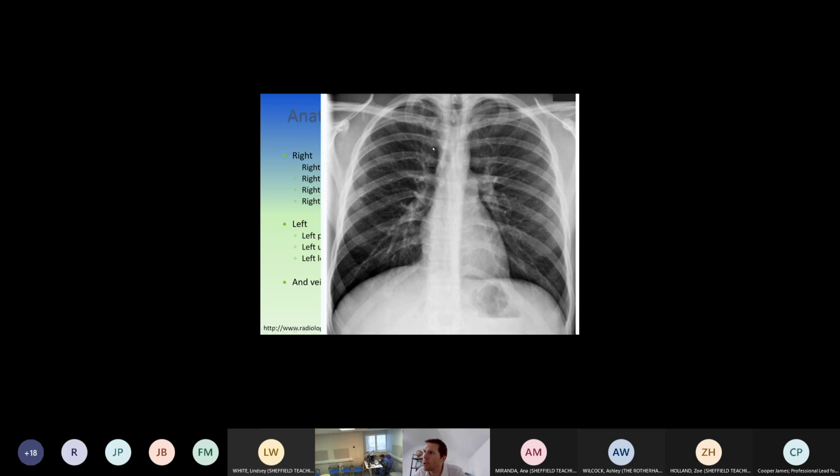What you've got there are the transverse processes of the thoracic spine overlying the ribs. It's giving the impression that you've got little fractures at the medial, the posterior aspect of these ribs. It'd be very, very rare to see rib fractures there in adult patients. So the place we're looking for rib fractures generally is around these lateral aspects of the ribs.